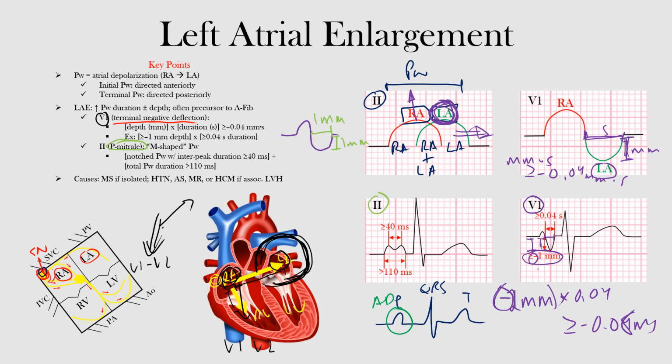So here's lead 2, and what we're looking at here, remember, this is our P wave, where you see that notching, okay? So you have a P wave that looks like this, okay?